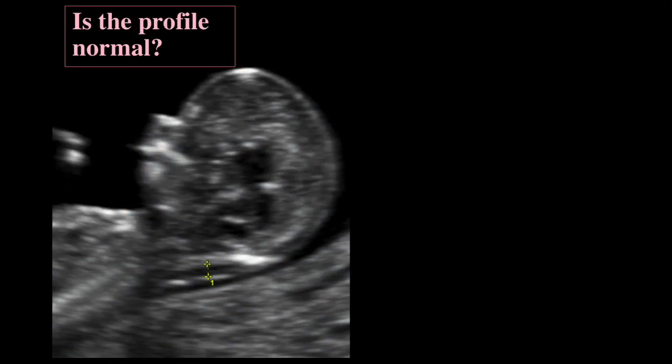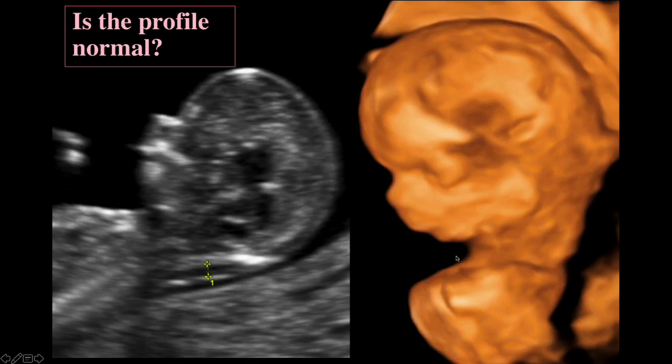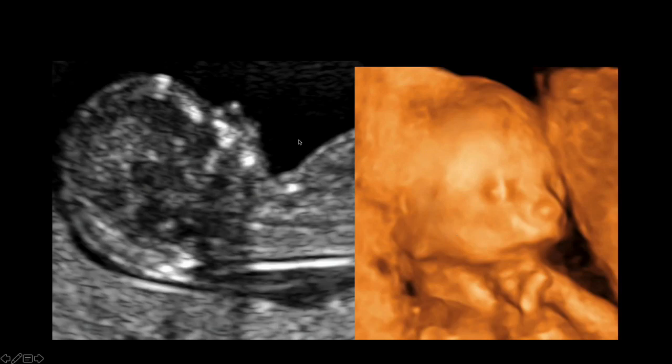A lot of these come in for nuchal translucencies, and well, this looked a little small. Really, the sonographer couldn't make it add up to where it should be along the nose if you draw the line. So we went in and showed that in fact it was micrognathia. Sometimes the micrognathia can be very severe.